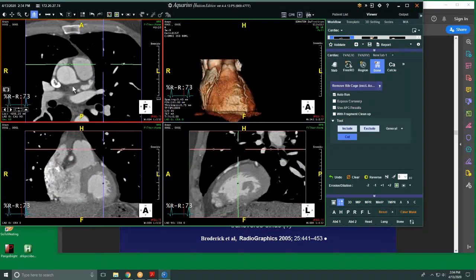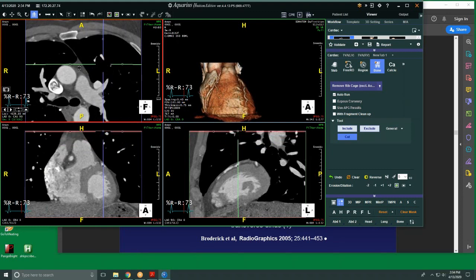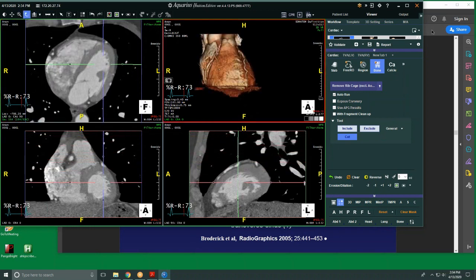This area is called the transverse sinus of the pericardium, kind of right on top of the heart between the aorta, the pulmonary veins, and pulmonary artery. See all this over here, that's just little aortic pericardial sinuses, the recesses of the pericardial sac, excuse me. Right over there, see extending anteriorly and posterior to the aorta. So that's the pericardium.